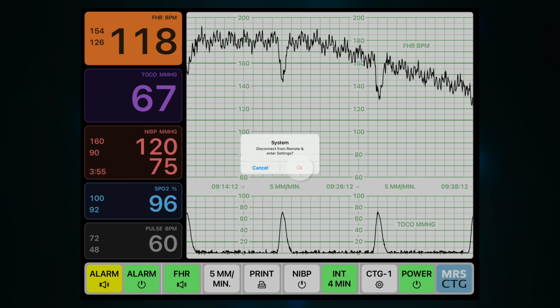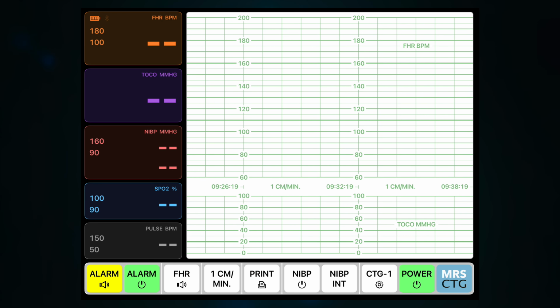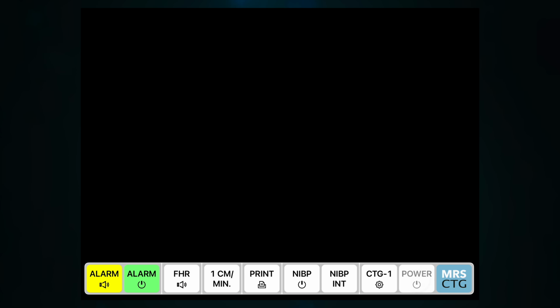The gear symbol calls up general settings of the simulator. Basic adjustments to the app must be made here. These remain active even after you exit the program. The long press power button disables the monitor and resets the settings.